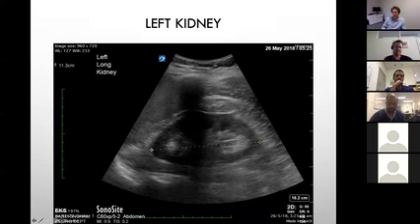You're allowed to pick on people, VJ, if you like. Oh, nah. Yeah. How about Ben? Do you want to kick off? Do you know what that is? I mean, it looks very much like a rib. Very good. Thank you very much.